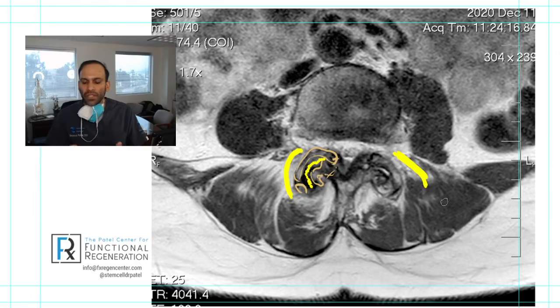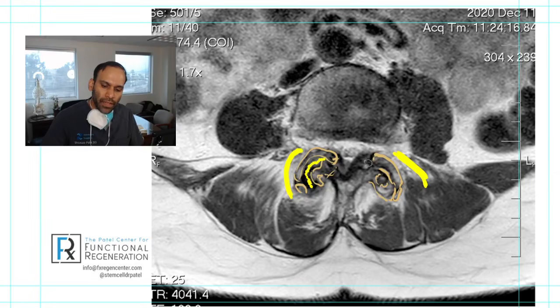So based off of the different pressures being placed in that area, we've seen a change in the direction of the joint. This one here has some bulkiness to it, right? Here's the bun. Here's some of what's called sclerosis, or some breaking down of the bone there. And then here is a little cyst right here, okay?